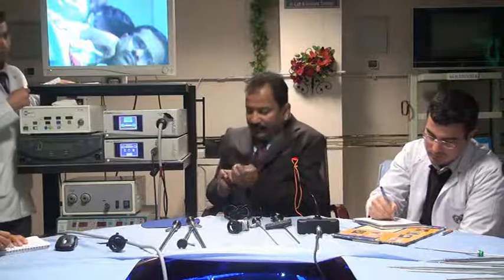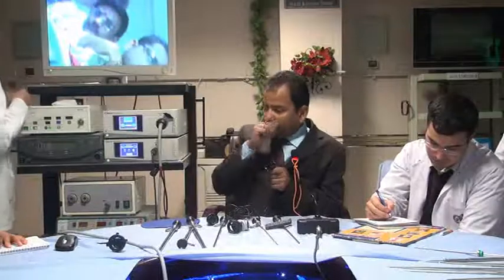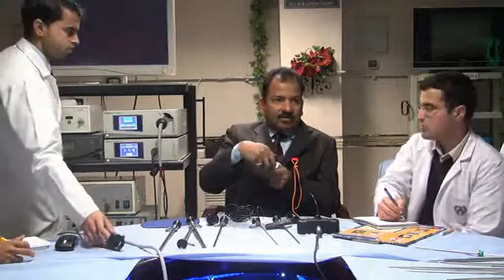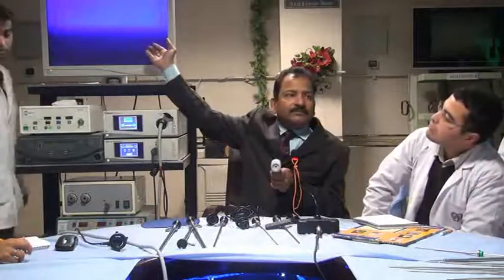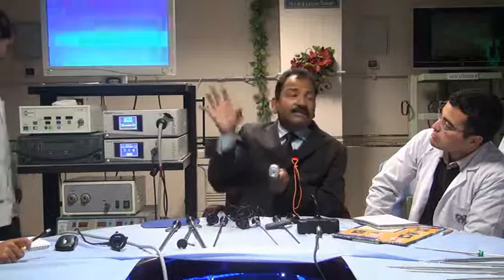It is important that you should not open the coupler frequently, because these are expensive cameras. This is the CCD. Alone, the CCD cannot show you any image. Just like if someone breaks our cornea or pupil, the retina alone is healthy, but it will see only light. If light is put, we will say yes, I can see light, but I cannot see the image, isn't it?